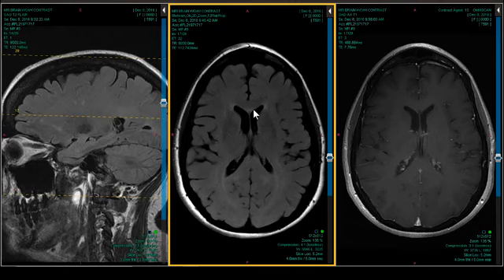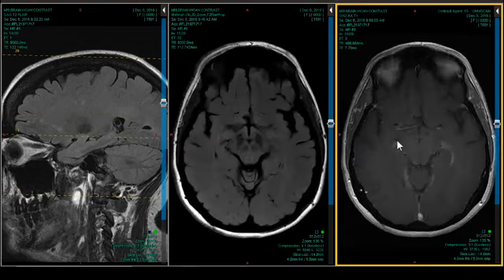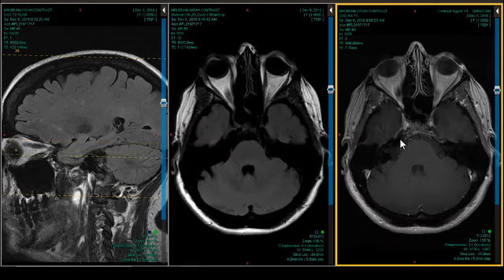Another one that is really a great mimicker of MS visually, not perfect but close, is Lyme disease. And those don't stay so tight to the corpus callosum, but they are periventricular, and the patients have the typical rash, and they might have joint symptoms. Now, you would expect those to enhance or get some basilar enhancement, maybe, if it was Lyme? They will get meningitis, but honestly, in my experience, seeing the white matter lesions probably 80% of the time is all I ever see. So even though they get meningitis, I typically don't see enhancing meningitis.